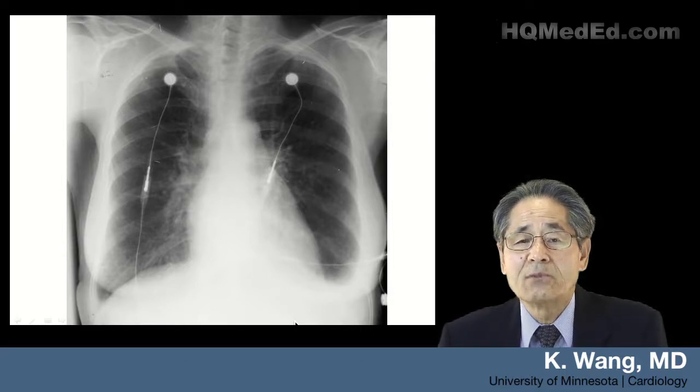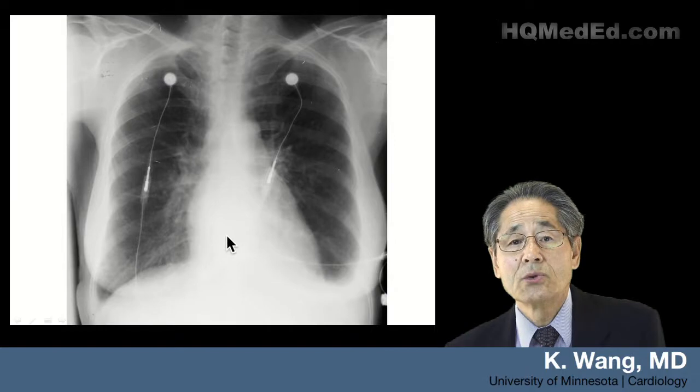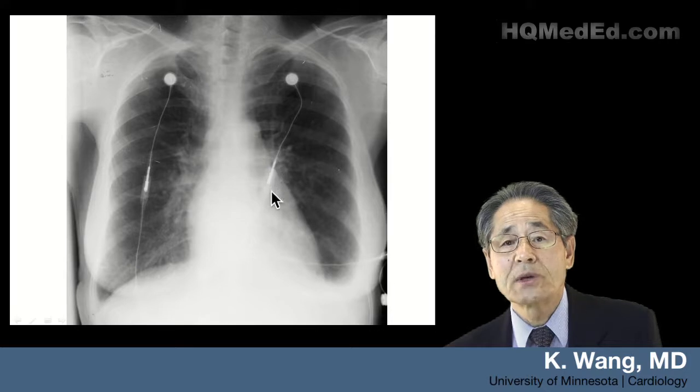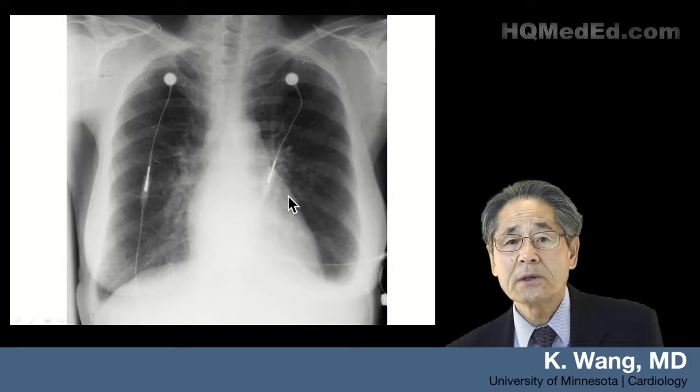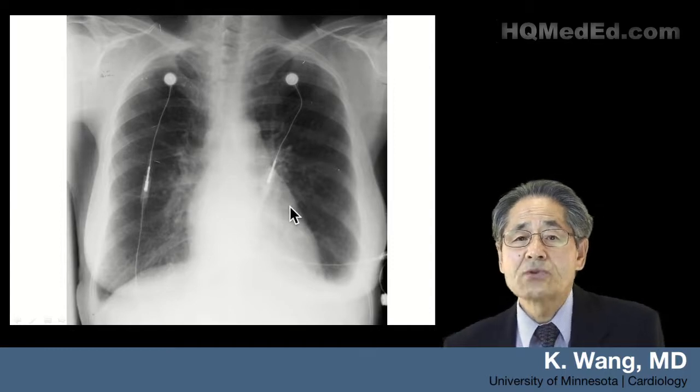I went down to the X-ray department. I couldn't believe what I was seeing. This is a picture of mitral stenosis. What I mean by that is that there's a double density here, which is a reflection of an enlarged left atrium. And as you know, there should be aortic knob, then pulmonic knob, then it should be concave, then ventricular bulging. Here there's an additional knob: aortic knob, pulmonic knob, then an additional knob. What is this? That's the enlarged left atrial appendage.